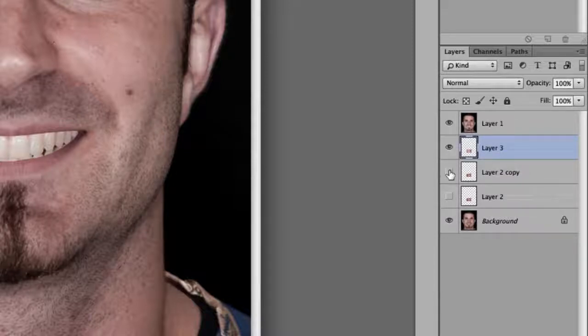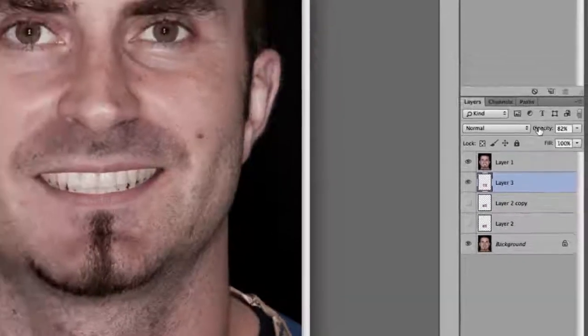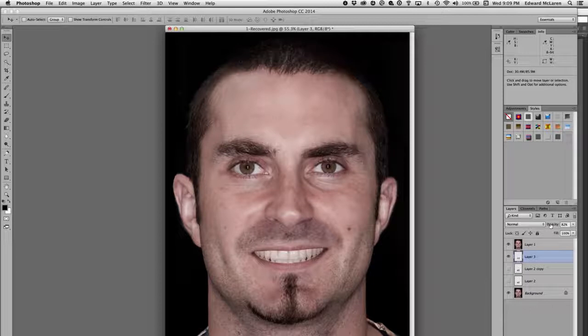Turn this one off and look through this, and then zoom in and see if we think we can do that. See if we positionally think we can do that without any adjunctive therapy, i.e. ortho and or perio. So you can see how easy it is to do the second and the third and the fourth one. I wouldn't have more than two or three library teeth, because the patient might have you doing it for hours. Anyway, that's how I use library teeth to show the patient potential alterations.